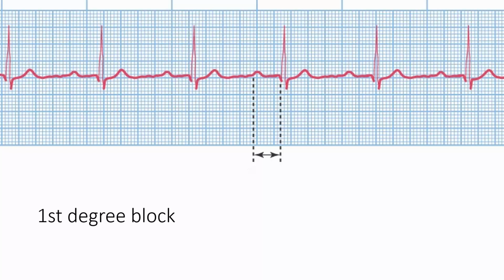So there's lots of things that can cause a first degree block, but when you are trying to analyze it using your 5-step method, like we can do on this one right here, the first thing, let's look at our rate, you count the number of complete QRS complexes.